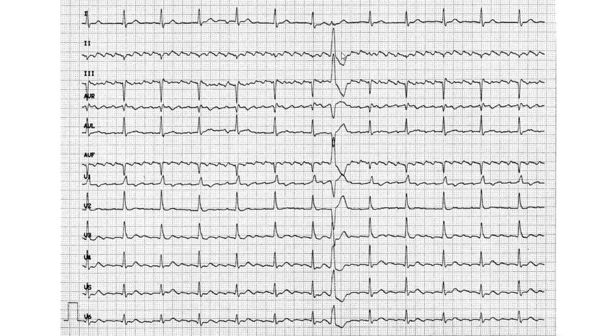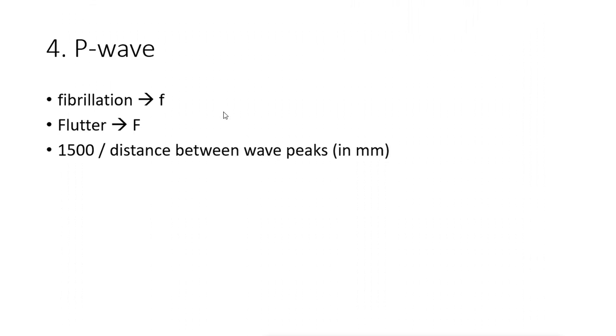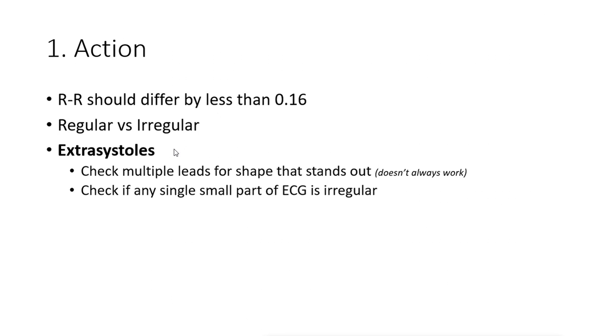So don't go and say that in this ECG, in lead 3, there is a QRS of, oh snap, 1 point something, or wait, 2, 3, 4, 5, 6, 7, 8, 9, something, so it's like a QRS complex of 0.36. Oh man, what is this person? How did he even manage to do that? You don't base your answer off of extrasystoles. Understand this, okay? That is the idea of extrasystoles.